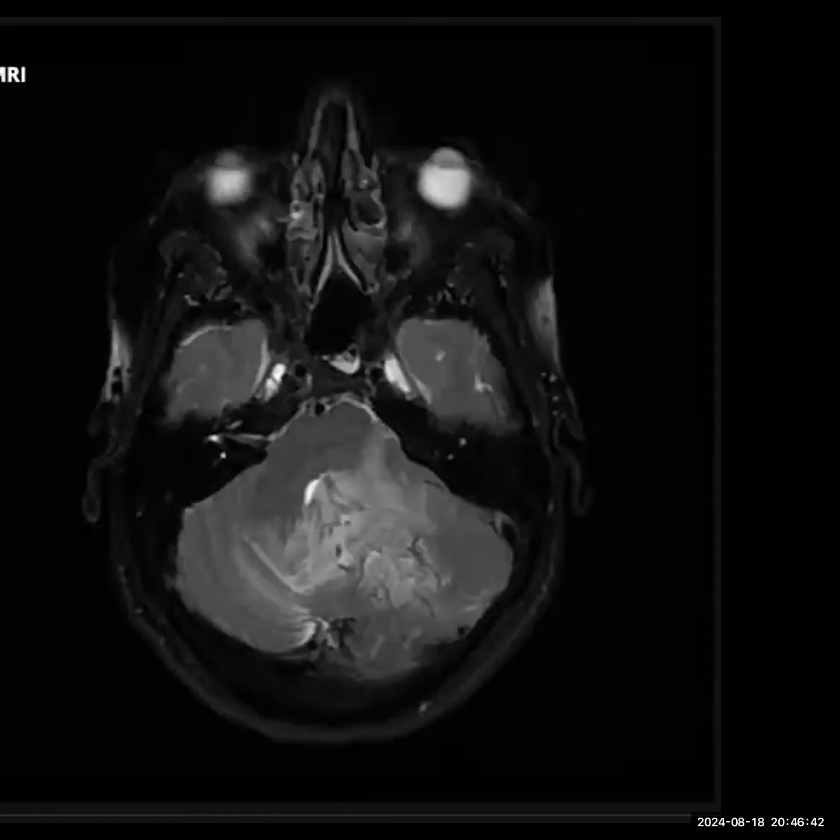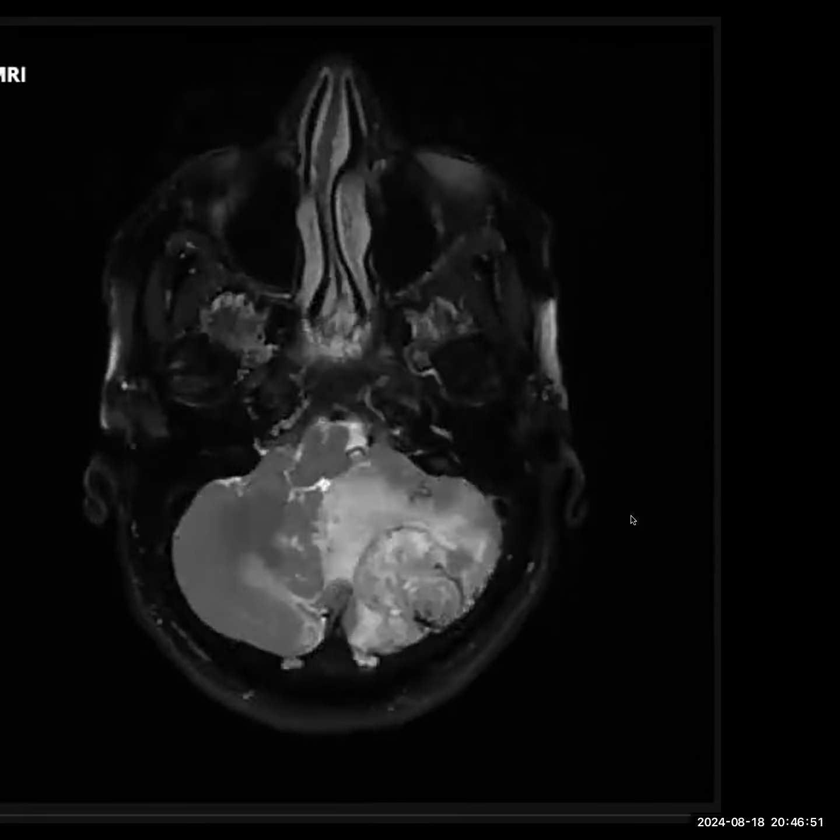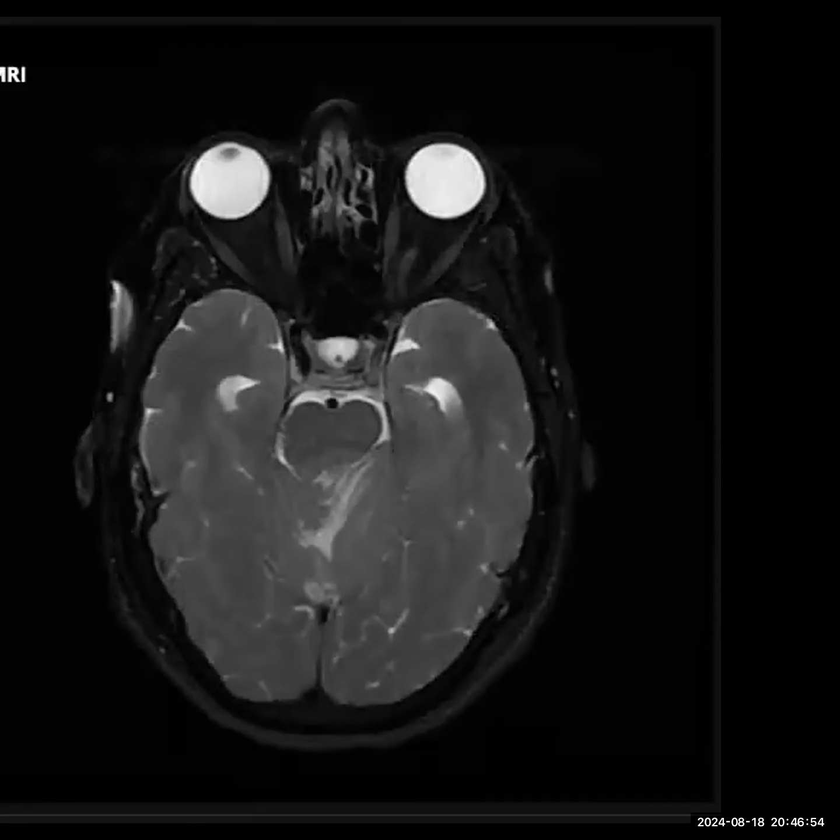It's fine as long as you ask for all the modalities. Because you just asked for T1, post-contrast and diffusion, of course. If you had asked for T2, I think you might have picked up these flow voids, and that might have changed your line of thought.